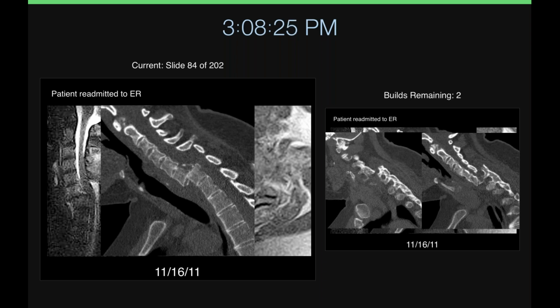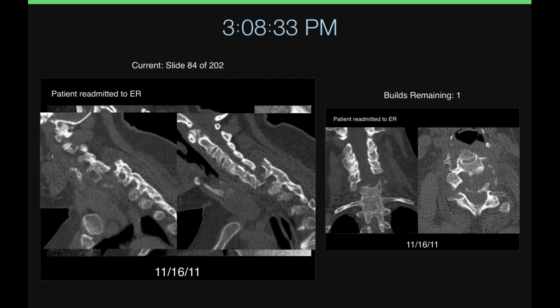And there's a CT scan. Okay, again, it seems that there is some protrusion into the spinal canal. There is anterolisthesis at the C6-7 level. I assume there's cord compression at that level. The posterior elements are also involved. So the fracture goes through, and this is a very unstable lesion. It involves both the posterior, central, and anterior components of the cervical spine.